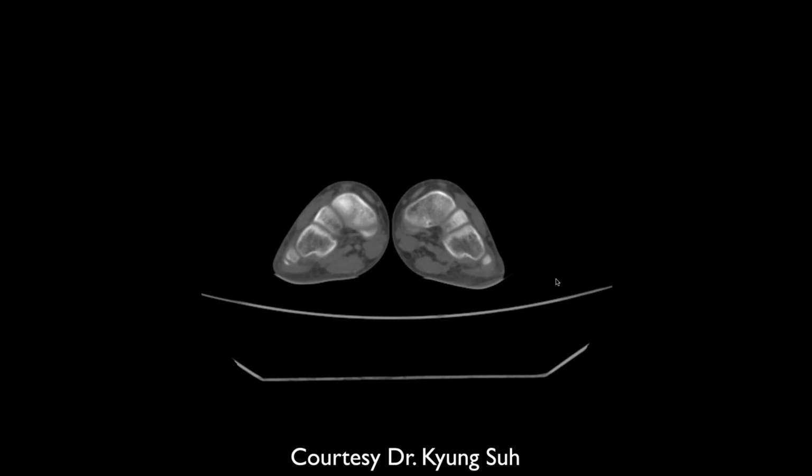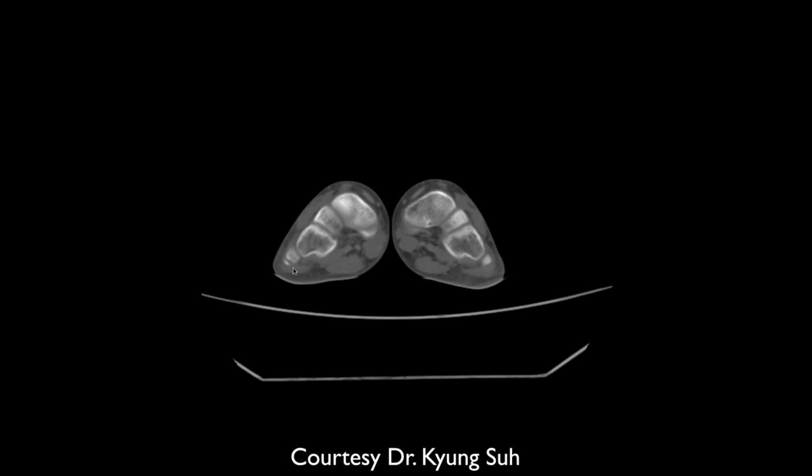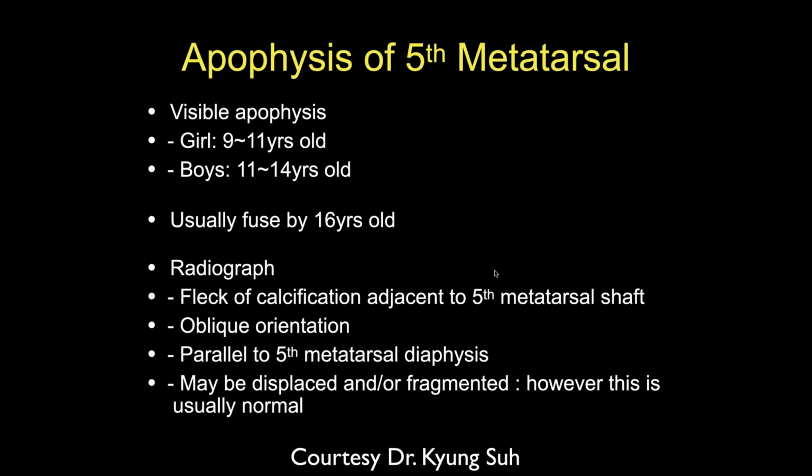I guess it's just an apophysis. The other side's more mature. Sorry about that. So that's just apophysis, the oblique orientation.